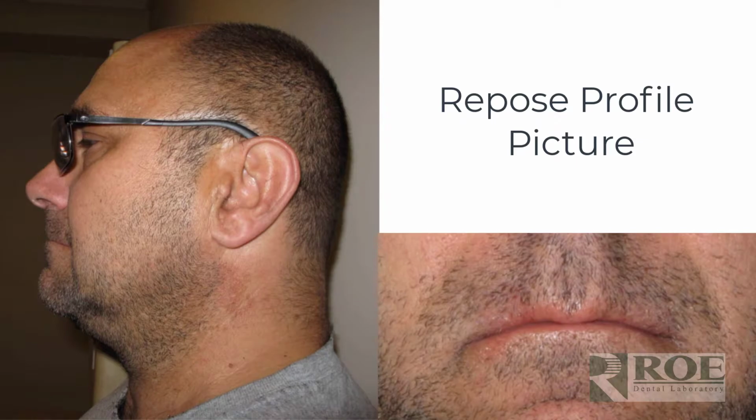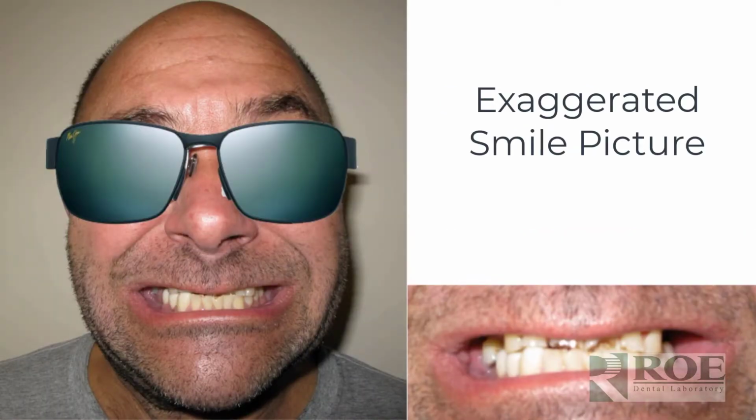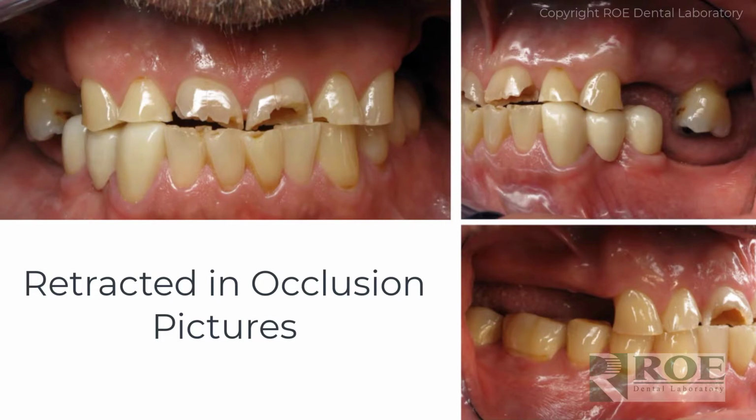So in the profile picture, you can also see the reverse smile and perhaps the need for some lip support, but that may be a judgment call based on the patient needs and wishes and the doctor. So these are some nice photos for us to help evaluate. And then, of course, an exaggerated smile is nice, or just a normal smile. In this case, the patient has a really tough time showing any maxillary teeth, so we asked him to do an exaggerated smile so we can really tell how long the teeth should be and help us determine how much to open the case. So with these photographs, we can really do a nice analysis.